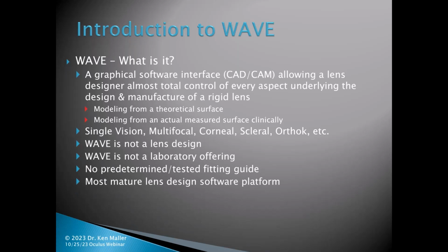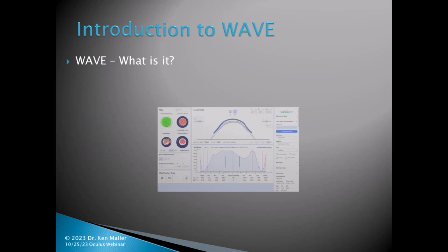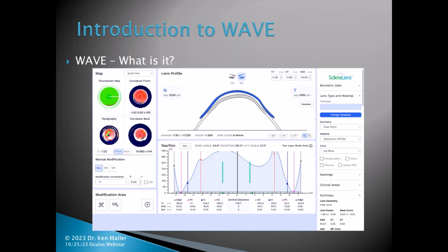It is the most mature lens design software platform that's on the market, and I've been involved with Wave since 2000, so that's 23 years now. It has most recently, in the last couple of years, been totally redesigned with a much cleaner interface and improved design tools. And most of the new users are on the newer software because of that. So this is what the new software looks like.